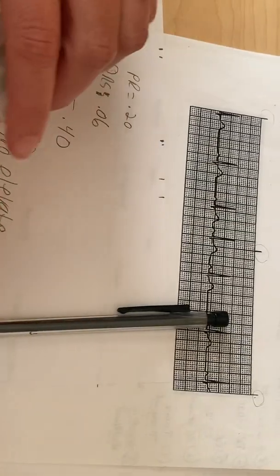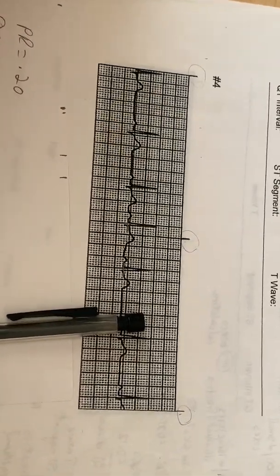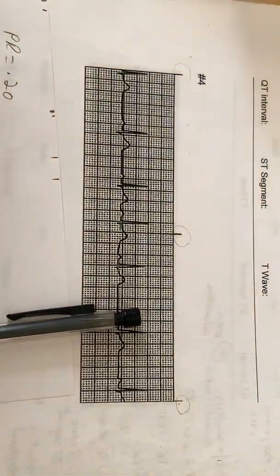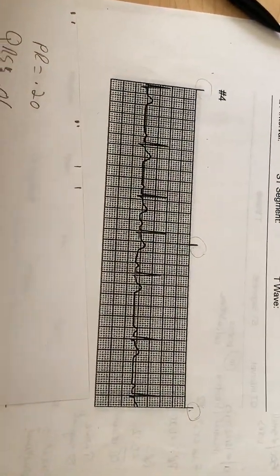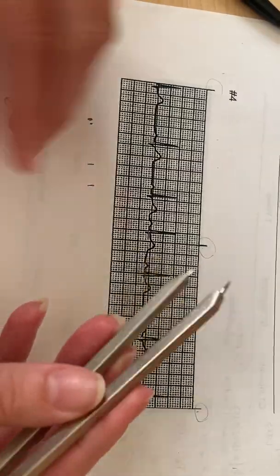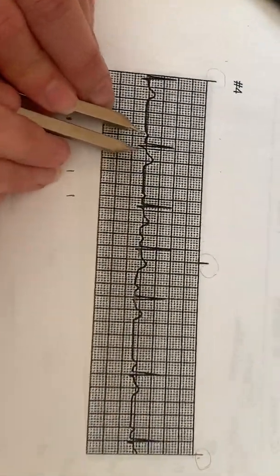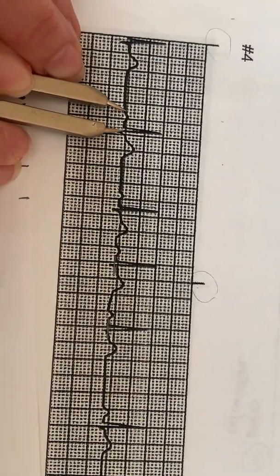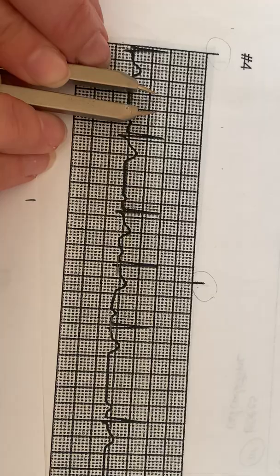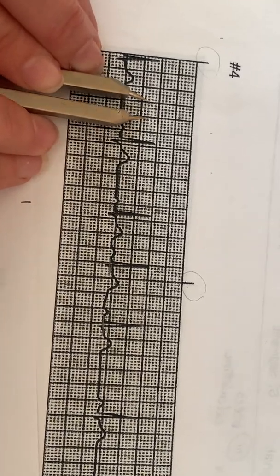We are just going to briefly do kind of the same thing, but with a caliper in case you have some. If you don't have a caliper, they are not required. Please just use the paper method. It's what I spent most of my life using, is the paper. If you happen to have calipers, there are little pencil points on the end. So you can do those same measurements from the beginning of my P to the beginning of my QRS. And then I take it up here and I see what I get, and I get the same measure. I get about a 0.2 for my PR.